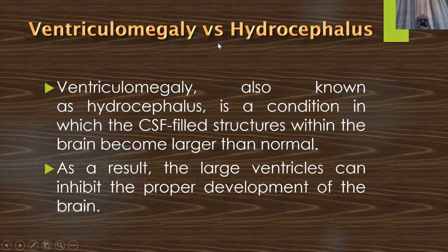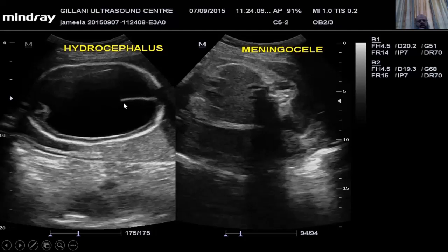This is meningocele along with hydrocephalus. You can see even the falx cerebri is not visible. Whole of the skull is with fluid. We have to perform differential diagnosis for it. We will have a few more pathologies which we will discuss, and then we will talk about the differential diagnosis of such type of presentation. If you get just fluid, what are the other possibilities?